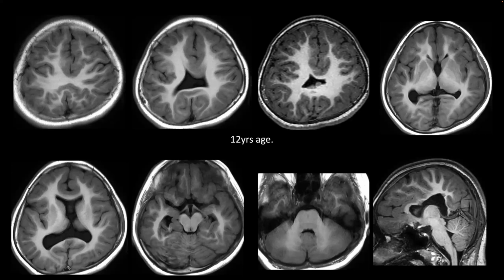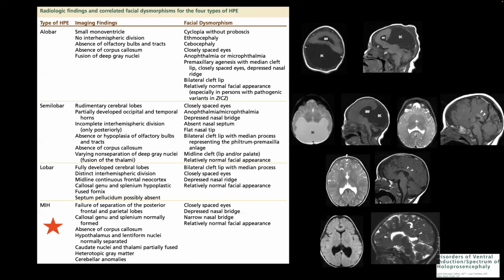Can I make two comments? Just as a repetition, perhaps not complete: an absent septum is seen in holoprosencephaly, in rhombencephalosynapsis, in schizencephaly, in severe hydrocephalus, and can be an isolated finding. So you have several options just looking from an absent septum.